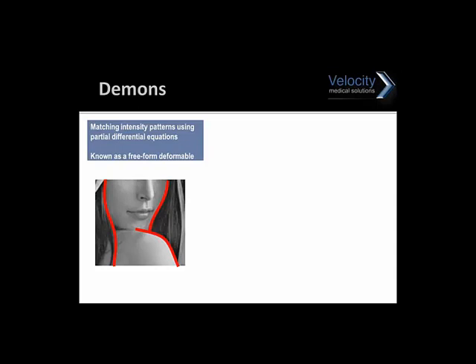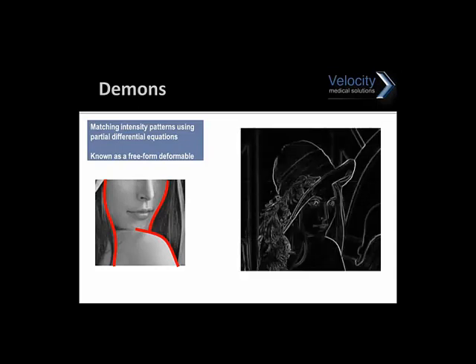Let's talk about the different deformable algorithms. Now, how does that apply to you and what can be deformed? The most common clinical cases that I see are normally deforming a PET-CT, diagnostic CT, MRI, structure sets from one scan to another, doses can be deformed, and cone beam CTs can be deformed.